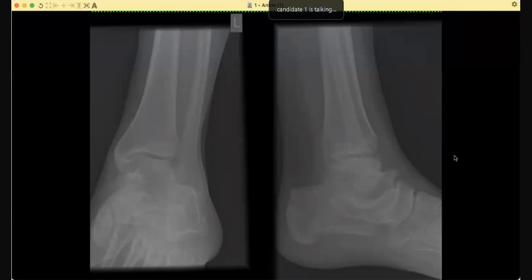There is also a significant soft tissue swelling adjacent to the calcaneus in that region. I would relay my findings to the clinicians and correlate with the clinical history. I suspect this patient will require cross-sectional imaging in the form of a non-contrast CT to characterize these findings further.